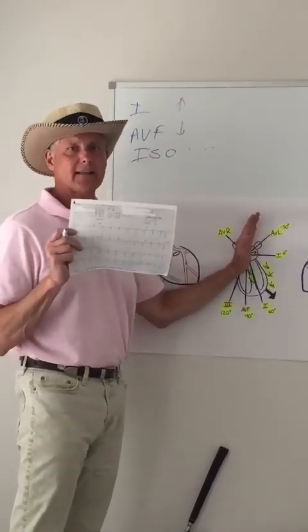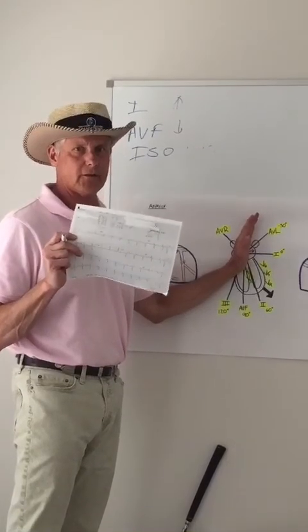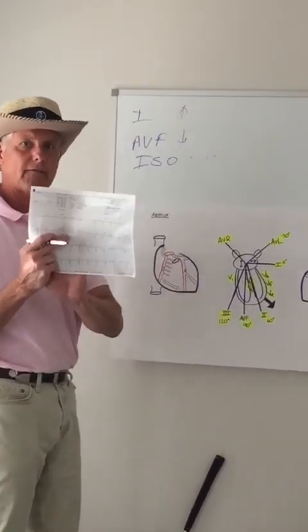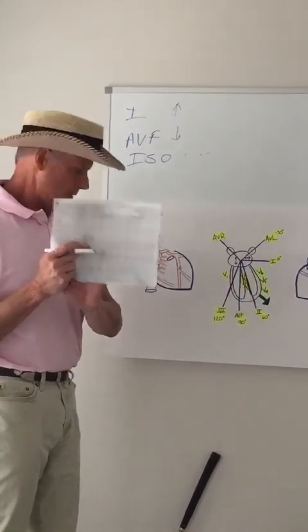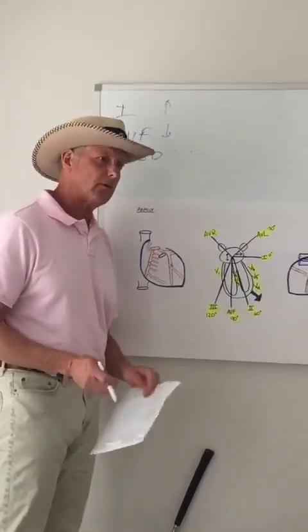This is classic left axis deviation, and this is an example of a left anterior fascicular block. To prove it to yourself, you look in AVL, and you see a tiny Q wave in AVL. Left axis deviation, tiny Q wave in AVL: left anterior fascicular block. Well, we got out of the woods, we lined up the putt, we made the putt. Now we'll go on to the next session.